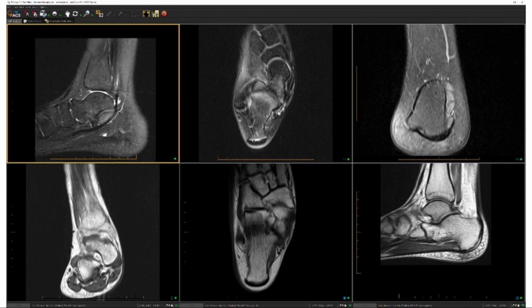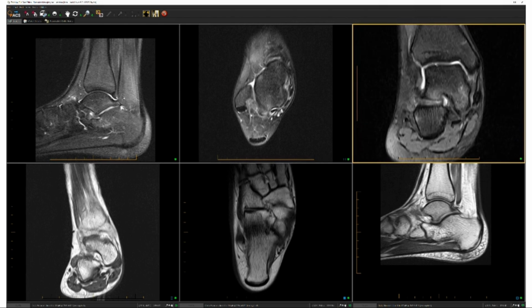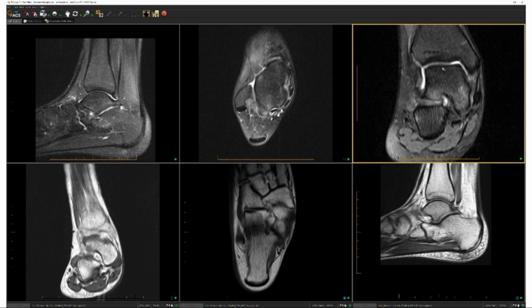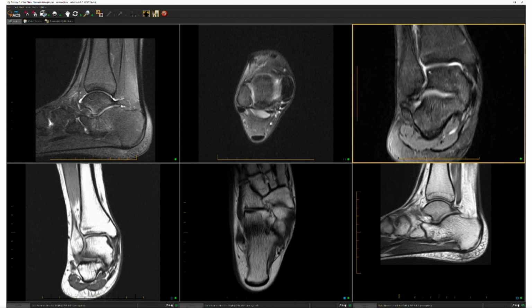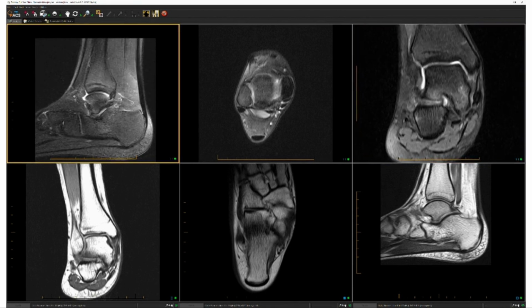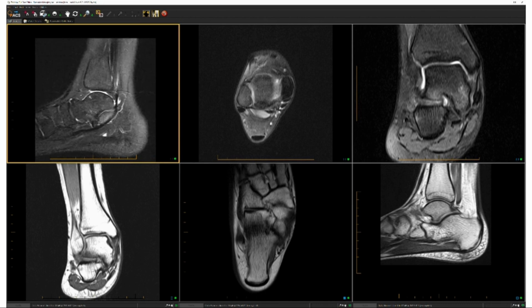Moving on from that region, let's take a look now at the bony structures. The first thing I want to try and clear is my talar dome. And when I look at this talar dome, I can't say that there's any actual unstable bony injury, but there are some features that are atypical, including hyperintense signal change, leading me to these poorly defined sort of chondral areas of partial thickness defect. And I think that you need a higher Tesla magnet to really be accurate about those. But that, again, would just give me biomechanical clues.